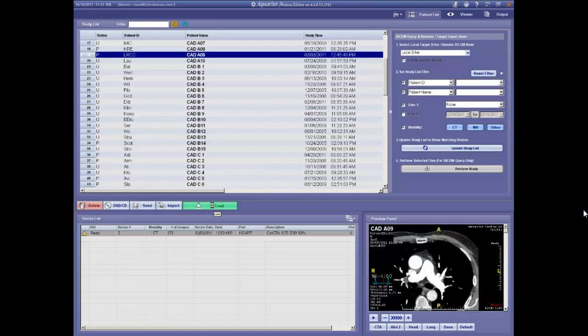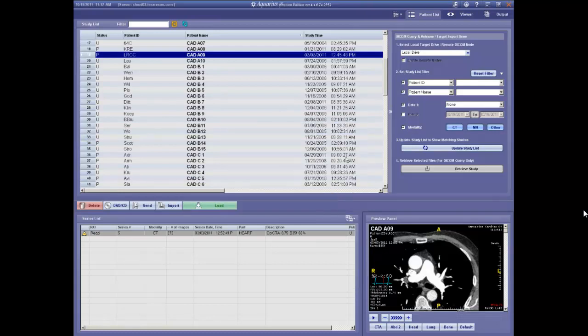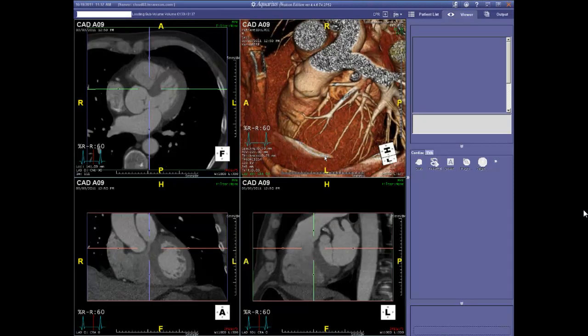And this is really meant to be a straightforward and simple case, which I'll go ahead and load, and as I load, demonstrate and talk about some of the tools that come up. And we'll let these various tools run and let this case assemble itself. There's a good deal of computer processing going on in the background.